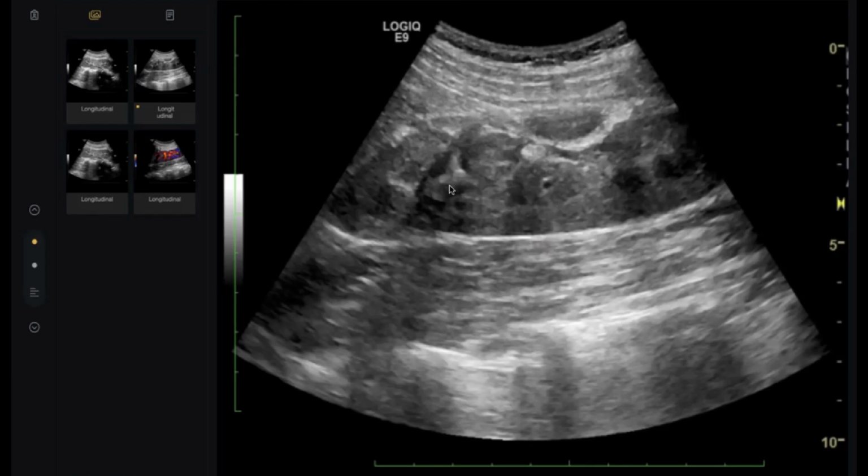It could be a horseshoe kidney. If there is no right and left, and it is crossed fused, it will not be overlying the psoas. You are correct, crossed fused ectopia, renal ectopia, but the side is not mentioned.